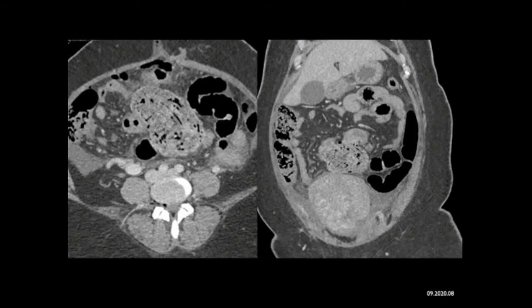This was a surgical towel. Now you could always say, how did you leave it? The count was correct after, but this was a blue towel left behind. The patient had to have surgery for it to be removed.